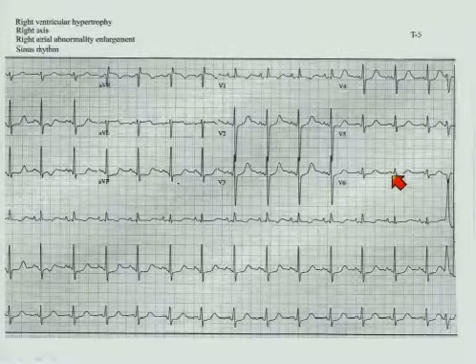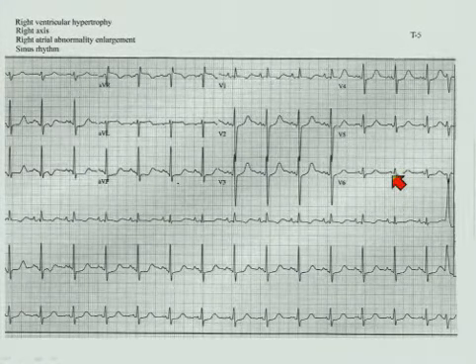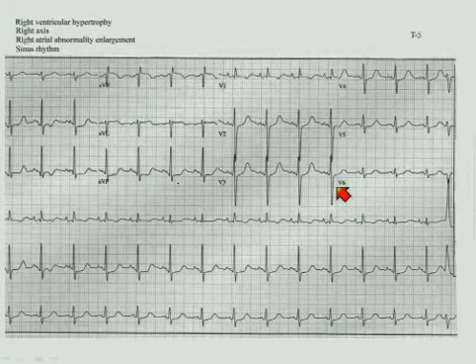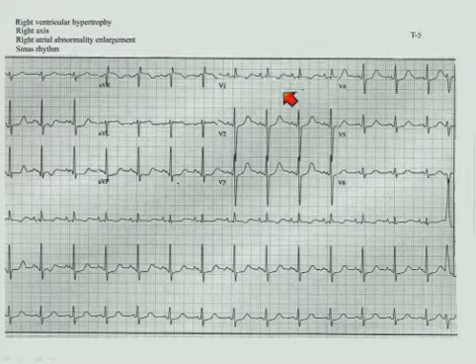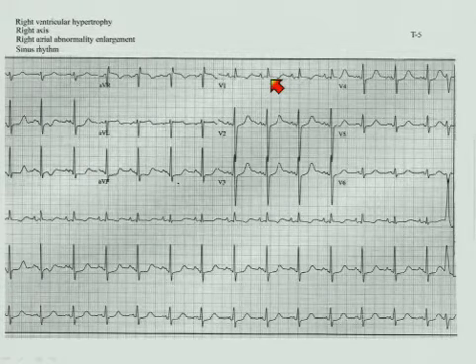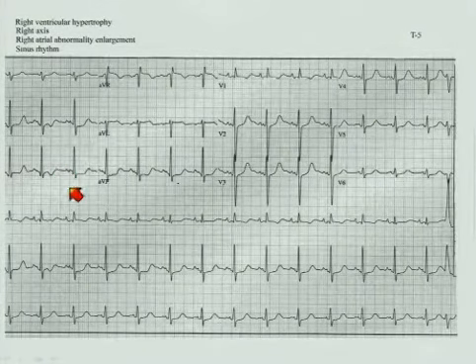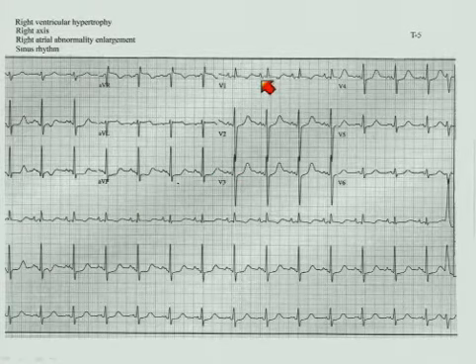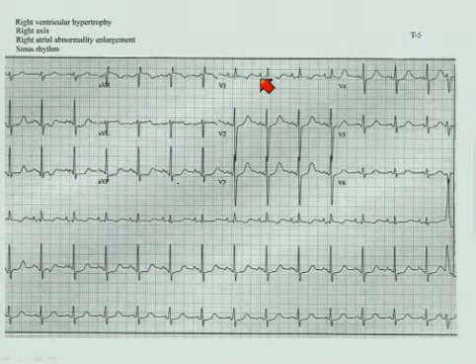All right, so let's move from LVH to RVH. There are several patterns of right ventricular hypertrophy. There's not just a single pattern. Here is a classic pattern of concentric right ventricular hypertrophy. And you'll notice that there is a prominent R wave in V1 with an R equal or greater than 5 millimeters. There's a right axis deviation of the limb leads. There is a right atrial abnormality. Notice the initial positive over 1 millimeter, over 40 milliseconds.